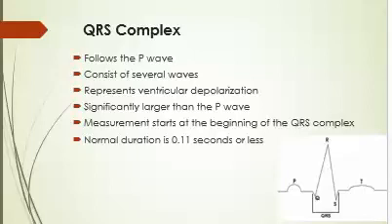Now here's the thing. The QRS, or the ventricular contraction, may look different in different patients, or even look different in the same patient, just depending on what lead we are using to look at it. Okay, so that's your QRS. And this one's a good one. Everybody usually can identify this one when they see it.